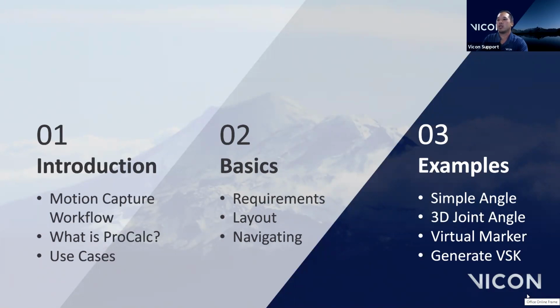Then we'll go into the basics, and as much as possible, I'm going to make sure that I'm actually operating within ProCalc. There are a lot of slides within this presentation, but I'm going to try to not use them as much as possible. Later I'll make those slides available so that you can use them as a reference, so that you can try some of these examples out on your own. So we'll go over the basics within ProCalc, the requirements for using ProCalc, the layout, and how to actually navigate within the software. Lastly, we're going to get into the examples, probably the most interesting part.